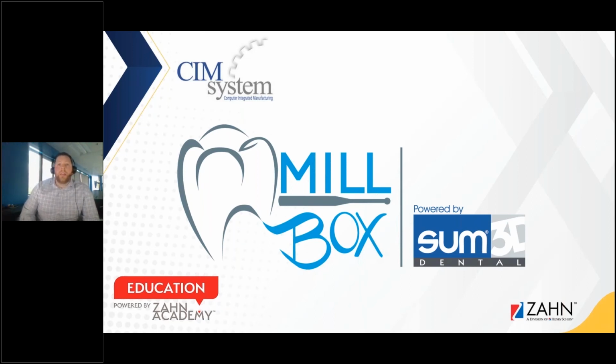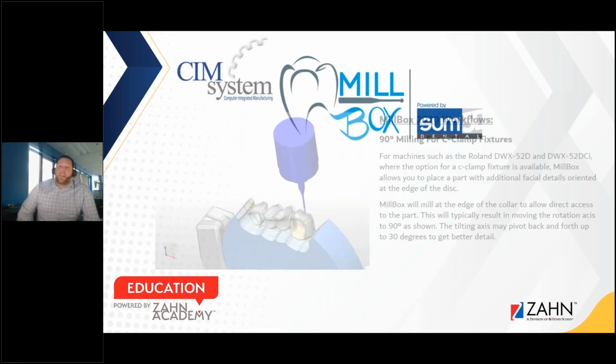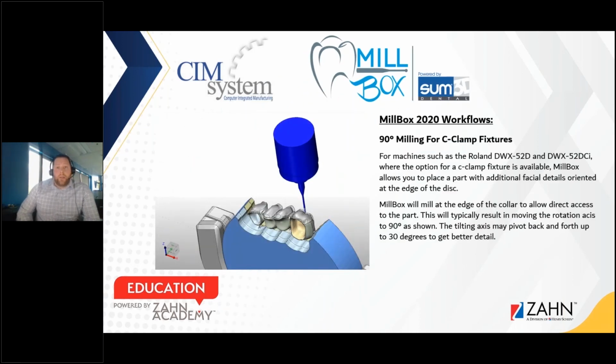So with that said, the first thing that I want to highlight is a big change that we have, which is the 90-degree milling process. This allows us to take units that were previously just milled from either the top or bottom sides of our mills, and nest them onto the edge of the puck, so that we can utilize the milling capabilities to engage the facial aspects of our crowns.